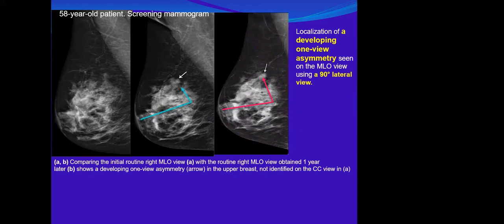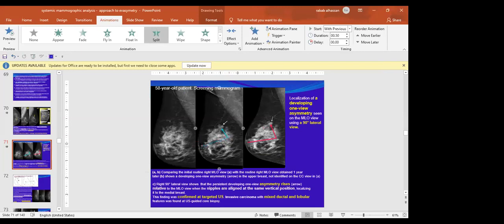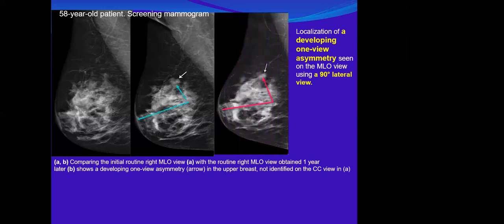Tell me, is it at the same level? No, it is at a higher level. Yes, higher level.